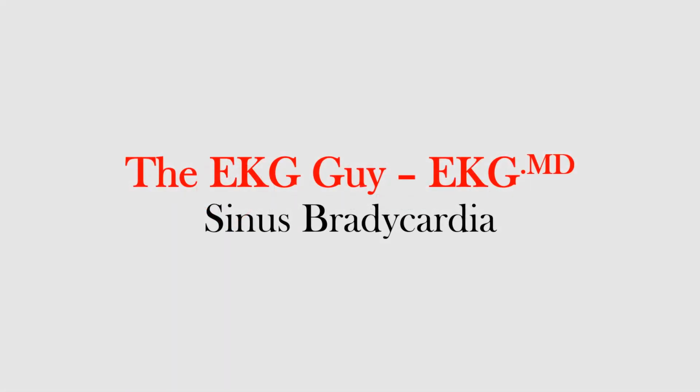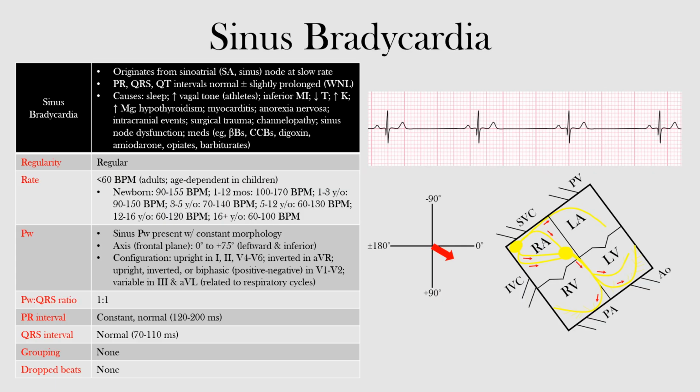In this lecture, we will discuss sinus bradycardia and how it would appear on the EKG. Sinus bradycardia is similar to normal sinus rhythm. Both are sinus rhythms, but have different rates. The sinus beats in sinus bradycardia occur below the normal heart rate range. Otherwise, everything else should be the same as normal sinus rhythm.